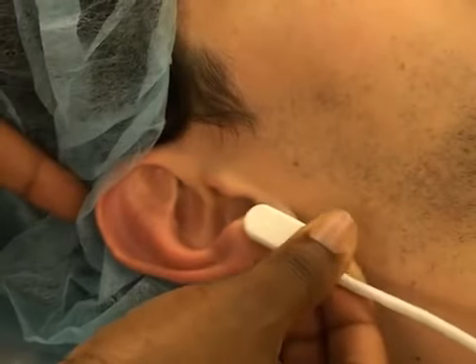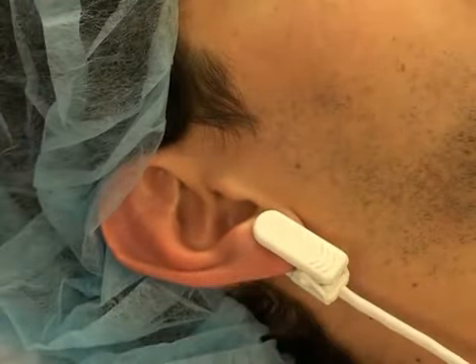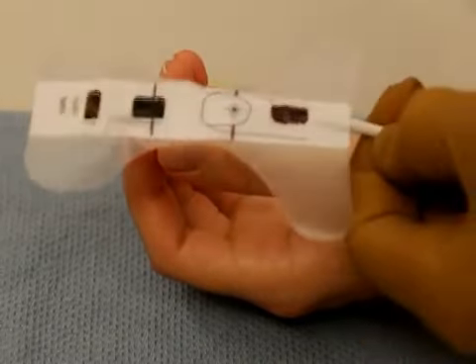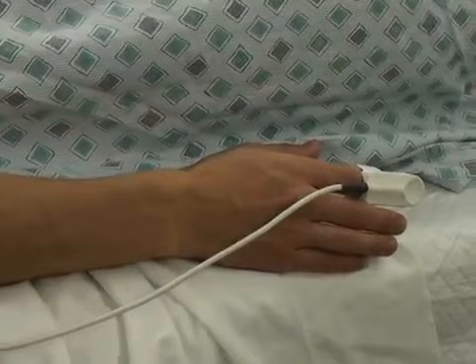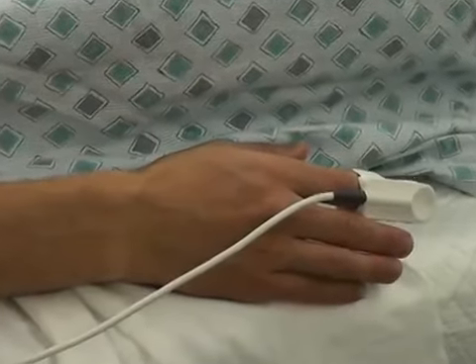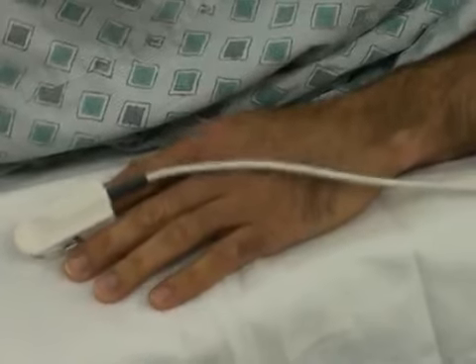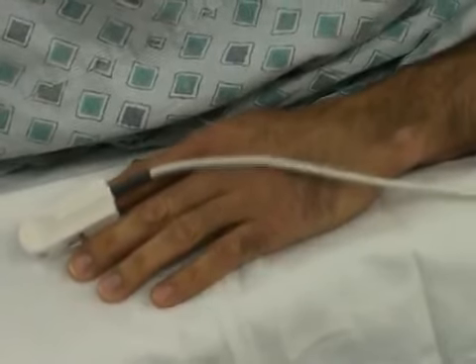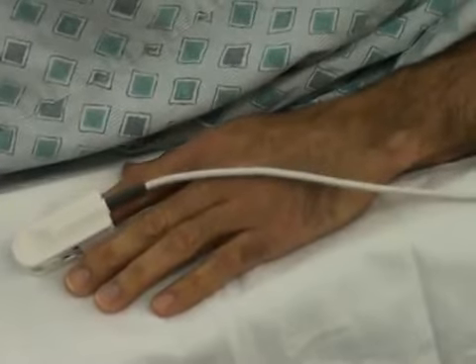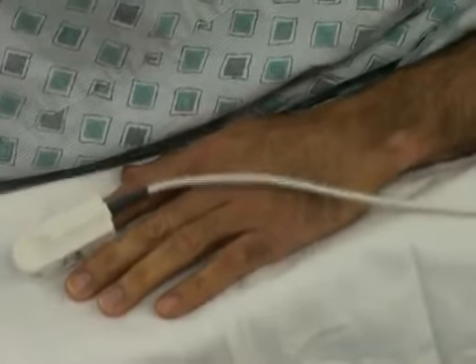Even though it is easy to use, the pulse oximeter can produce erroneous data in certain circumstances. One common problem is the occurrence of movement artifacts when there is movement at the site where the probe is placed. This may interfere with proper function and most often occurs if a patient is shivering, has seizures, or is being transported by ambulance or helicopter.